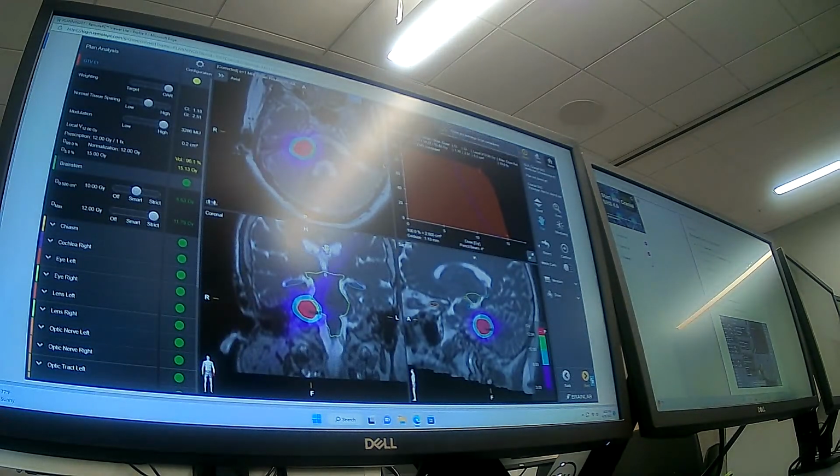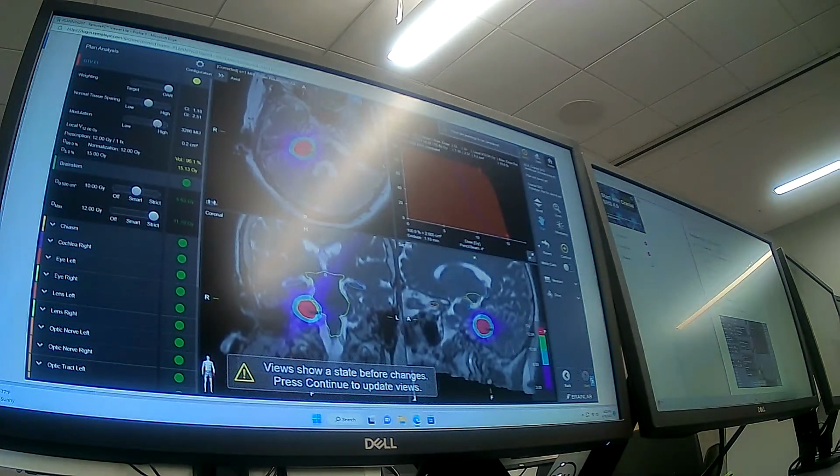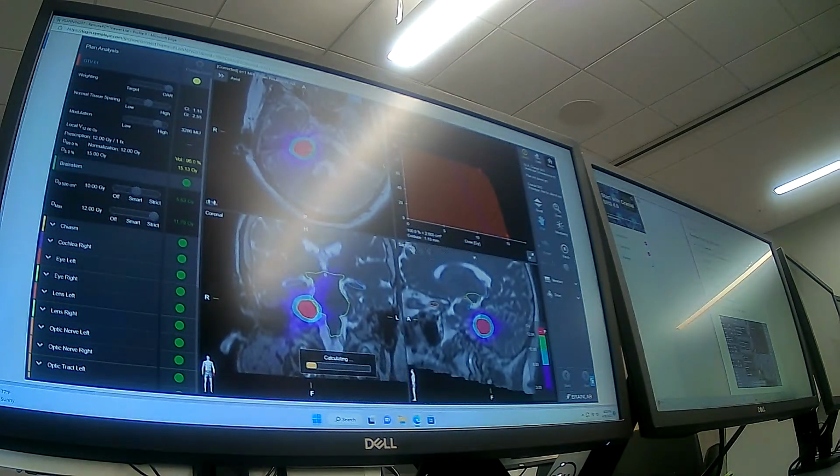But you were in like a conference and you didn't have the full planning software. I saw that last time. I just can't remember how to get there. Oh, it's yellow. I got it to where everything is green and this is yellow. But it's just because of the volume.